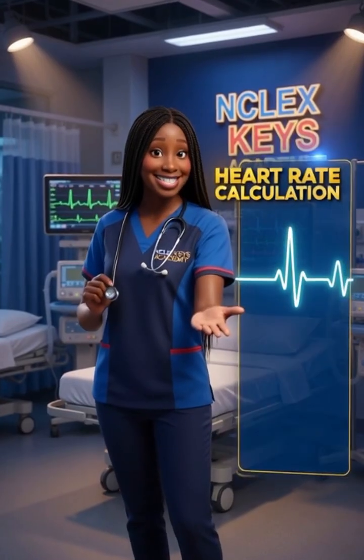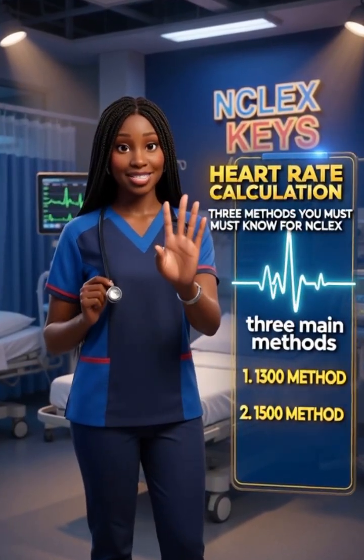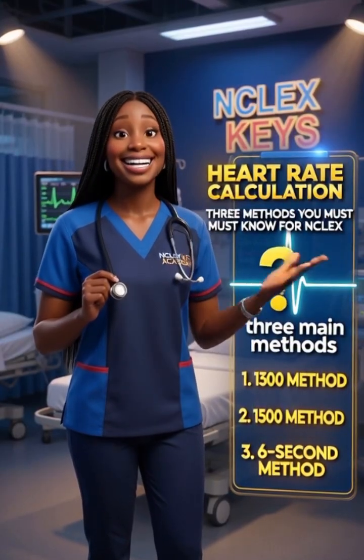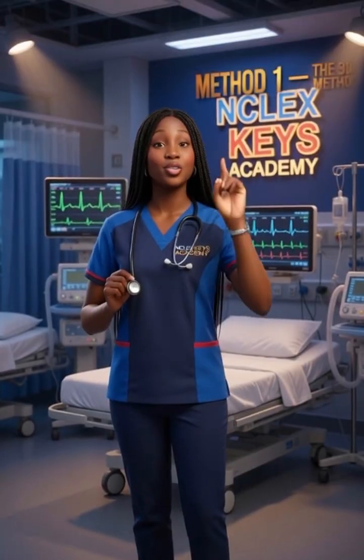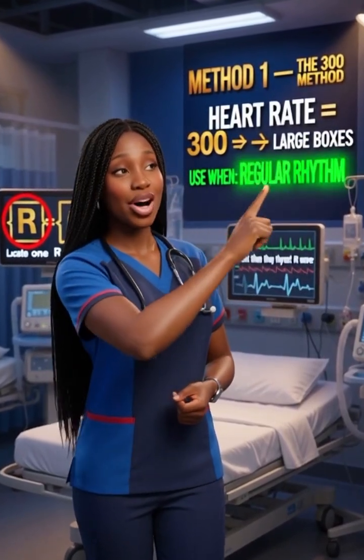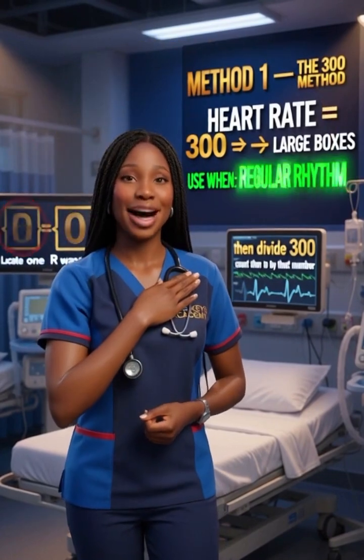When interpreting an ECG, one of the first things we determine is the heart rate. There are 3 main methods used to calculate heart rates, and each method is used in different situations. Method 1, the 300 method, also called the large box method. This method is used when the rhythm is regular. Locate the R wave, count the large squares to the next R wave, then divide 300 by that number.